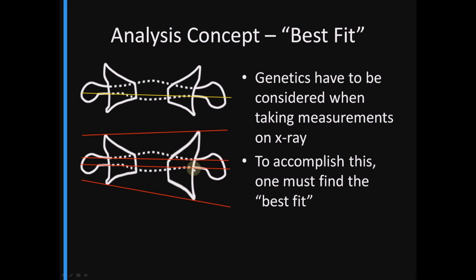Both the superior and inferior arch attachments to the lateral mass seem to be in relatively good agreement, and therefore we could use either one of those as our primary reference. And with the Grostic-based procedure, almost always selecting the posterior arch inferior surface attachment to the lateral mass, we would have been able to select that as an accurate reference of this patient as well.